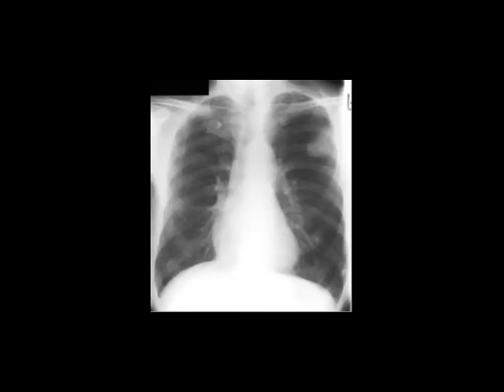Look in the neck region, as we mentioned, to look for sutures. If this patient, for example, had hyperparathyroidism and had an operation, or a thyroidectomy, and has, for example, lytic metastasis, you can think about this if he just shows you the X-ray. The other region will be the retroperitoneum.